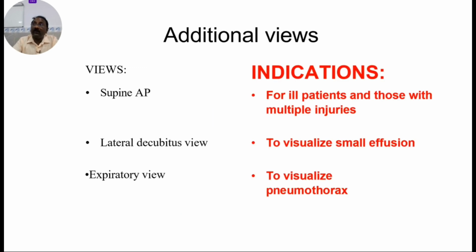Supine film we often do in your emergency wards or in your ICU for all ill patients and those with multiple injuries. Lateral decubitus view sometimes to note small effusions. You are in doubt whether it is a pleural effusion or a consolidation. If you get a lateral decubitus view, that clearly shows you some amount of the fluid. That is the decubitus picture.